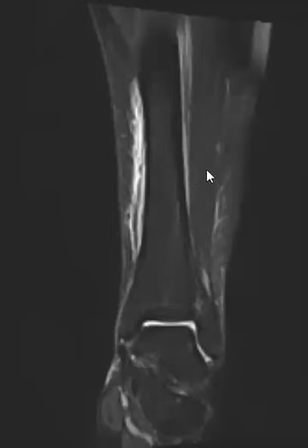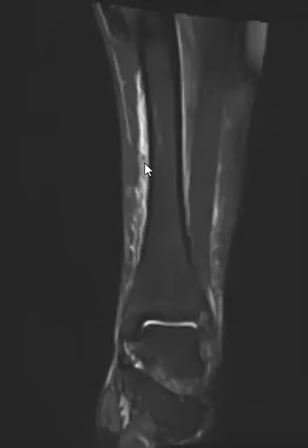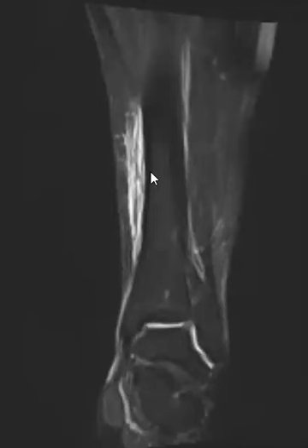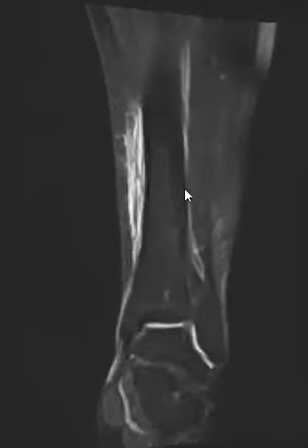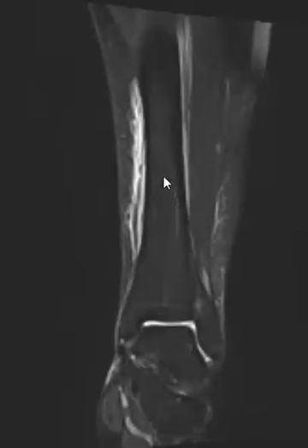So on the low end of the spectrum, if you just see edema in the soft tissues over the periosteum, you call it shin splints. And when it progresses to more advanced stages where you have marrow edema, you say there is evidence of a medial tibial stress syndrome with marrow edema or stress reaction within the tibia. And I'll usually qualify there is no stress fracture line. That's more of an intermediate thing with the soft tissue edema and marrow signal changes.